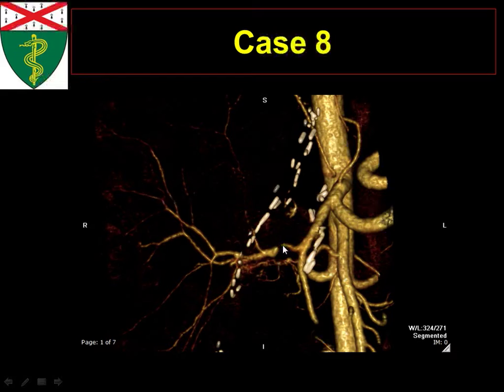Or what don't you see here? Exactly. You don't see the hepatic artery really nicely across this area, and it's probably completely stenosed. There's post-stenotic dilatation. The areas where we were interrogating the liver were like here, and maybe a little bit over here, and here. But we couldn't get to that portion over here. So that's where the stenosis was.